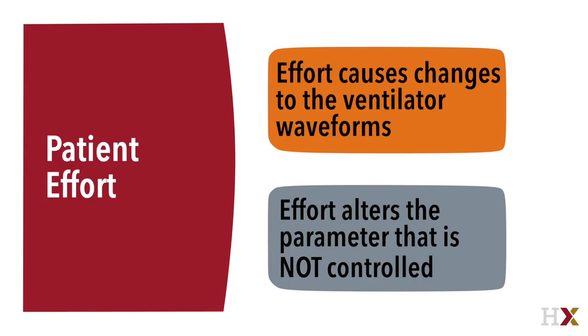In pressure assist control and pressure support, patient effort is less likely to change the pressure parameter because pressure is controlled and targeted. Therefore, it will change the flow waveform. This is very important for understanding how to assess the patient's interaction with the ventilator at the bedside.